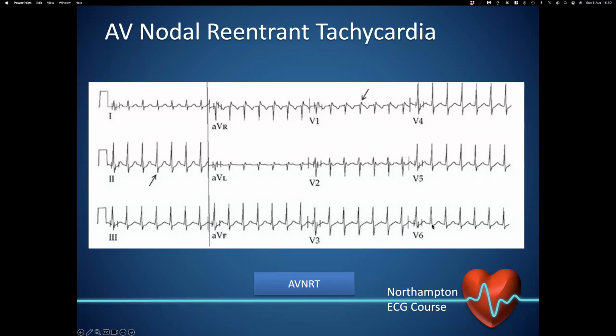So seeing this upsloping minor lateral ST depression is very common. When we exercise pilots and they're youngsters, we see this sort of thing all the time. And if you measure that at J plus 60 to 80 milliseconds, then that will be normal. Although it looks grossly abnormal, when you measure it formally at 60 to 80 milliseconds, it's actually normal. So what I mean is it's non-ischemic. No, not at all.